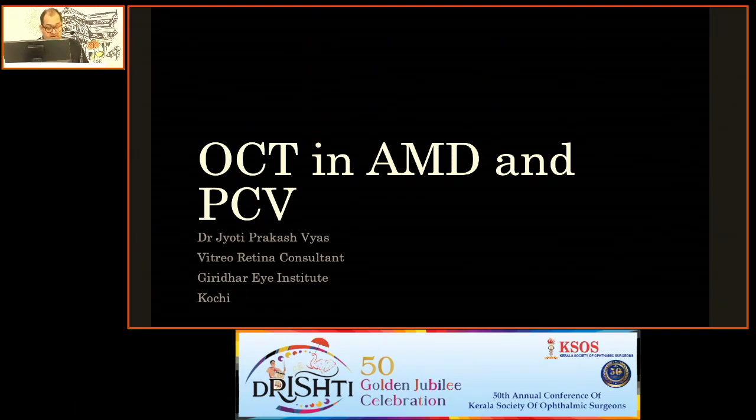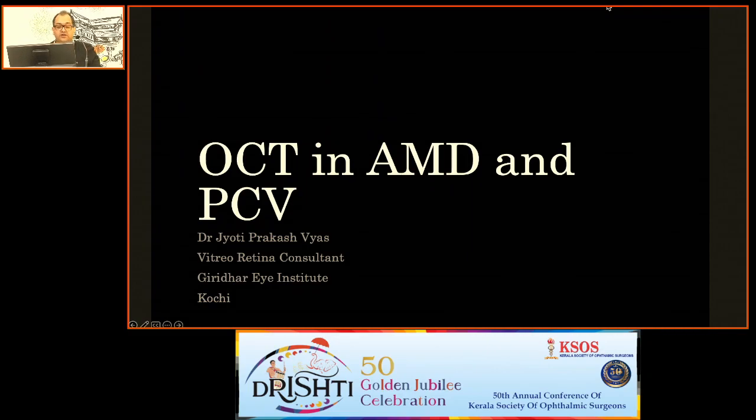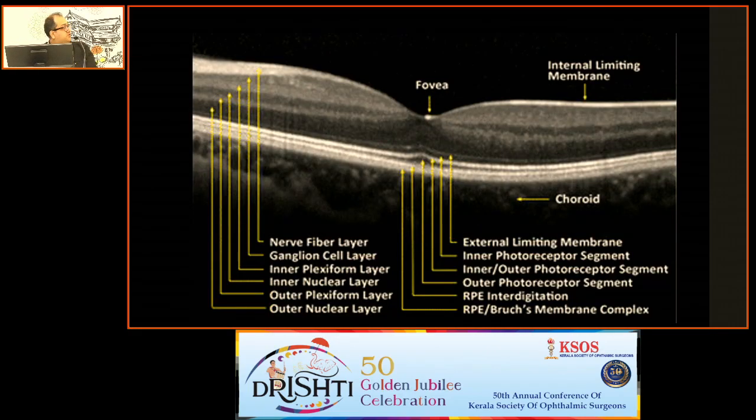Good morning, all. Thank you, Dr. Anubhav, for the invite to the IC. I'll be talking about OCT in AMD and PCV. So this is the normal looking macula on an OCT. You can see the well-defined layers, and we'll be trying to explain what to look for and interpret in a case of AMD as well as PCV.